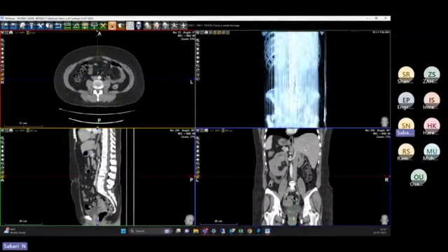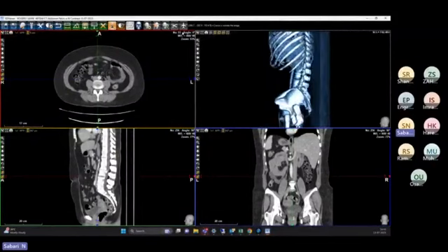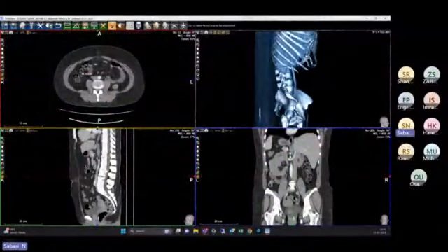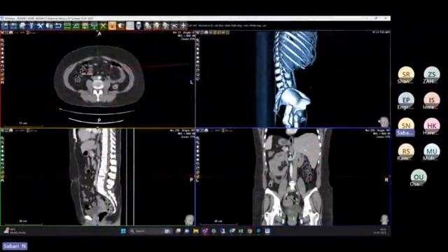So here also, whether you want to remove the bone or vessels and all those things, even in this also you have a lot of functions. So where I can say, okay, let me stop this.